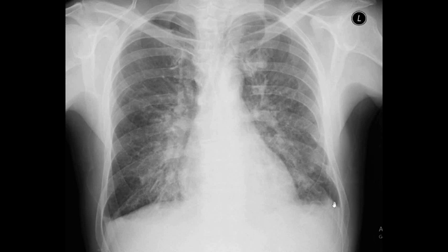Also, one important thing, here is the costophrenic angle. Normally, the costophrenic angle is sharp and dark. Here, it is almost horizontal and there is white here. That means that we have pulmonary edema, but we also have pulmonary effusion here. So it means that there is fluid also in the pleural space, but there is also fluid accumulating in the alveoli. And this patient will definitely have dyspnea and tachypnea and some underlying condition that causes this fluid accumulation in the thorax and in the lung tissue.